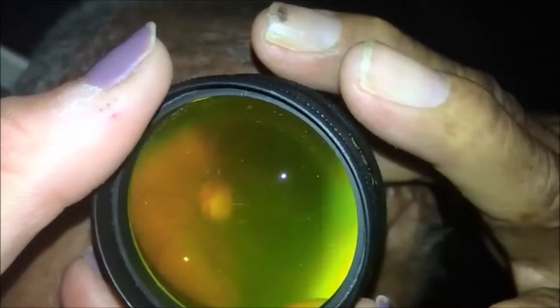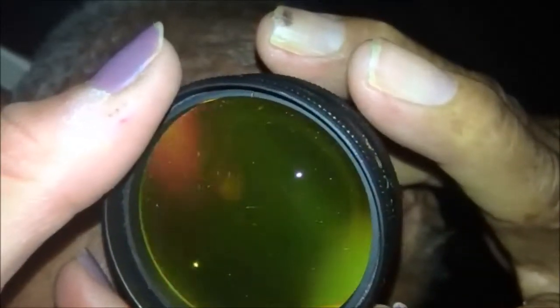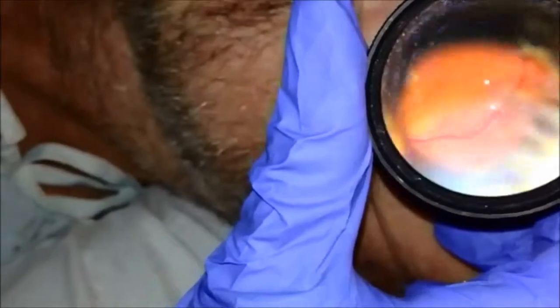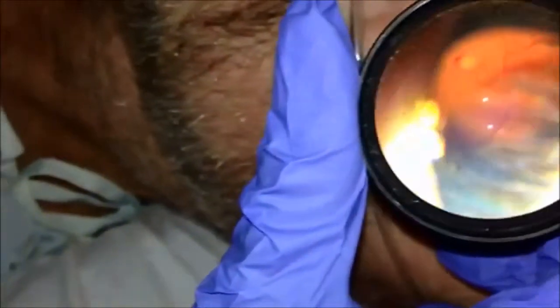In patients with cataracts, like in this case, it could be cumbersome to take a good quality image, but it's still possible to assess the posterior pole. In this immunosuppressed patient with leukemia, you can assess the posterior pole, and you can also detect infiltrates inferotemporally and perifoveally.